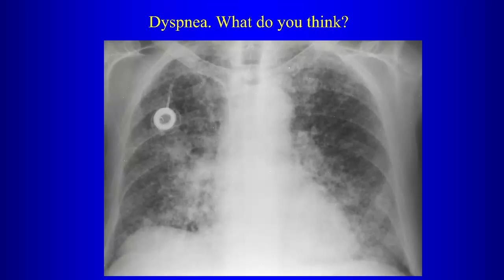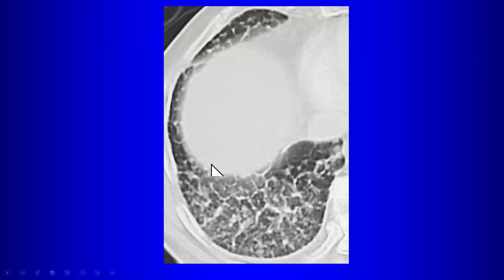Could it be malignant because there's like a chemo port? Yeah, so one clue that you have was that there was a chemo port here, right? And secondly, do you think this is smooth or nodular, this thickening of interlobular septae? Nodular. Yeah, it's somewhat nodular. So what's your diagnosis here then? Lymphatic. Yeah, so this is an example of lymphangitic carcinomatosis.